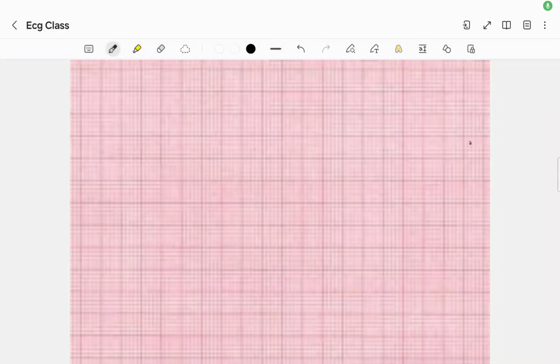So we have learned how to calculate the heart rate, right? Which was step 1 in reading the ECG. So step 2 is figuring out the rhythm. Now I'm gonna have a more comprehensive discourse on rhythm analysis as this ECG series goes by. One video is not sufficient for explaining rhythm analysis. Okay, so there's a lot of things to talk about when it comes to rhythm analysis.